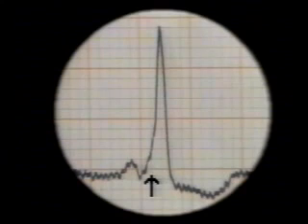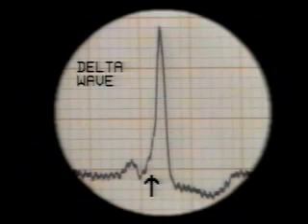Now study the QRS complex more carefully. You will notice that only the initial portion is wide and slurred. The downstroke of the R wave and the S wave are perfectly normal. This slurred upstroke at the beginning of the R wave is called the delta wave. The delta wave is seen in those leads which show a tall R wave, usually lead 1 or V6.